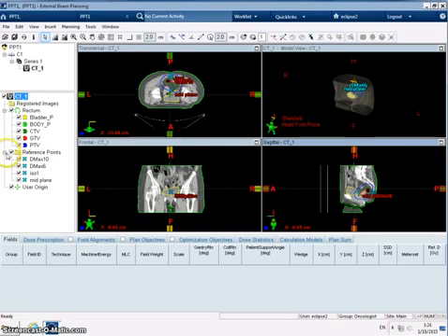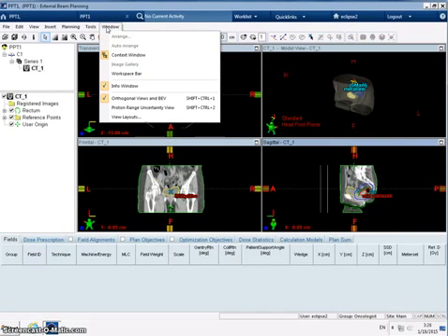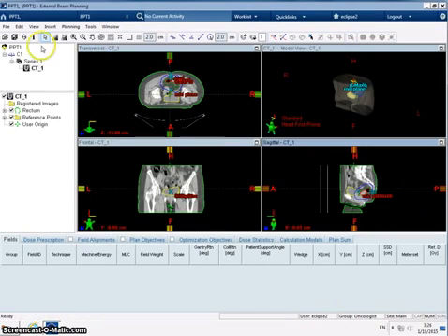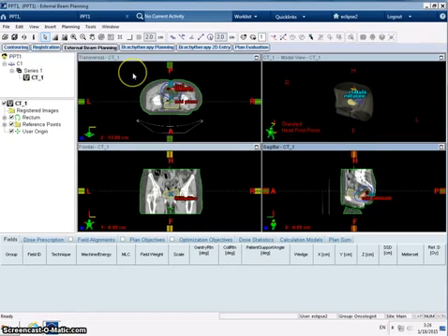So I'm not really interested in those at the moment, so I'm just going to minimise those. We can see here, we can view the patient in different planes, and actually there's a number of different ways that you can set the patient view. So have a click on those and a play with the different views if you like. I tend to stick to that one there, the orthogonal views. And one thing that makes life easier is if you click on this workspace bar, and that allows us to flick between the different modules if we need to do that.